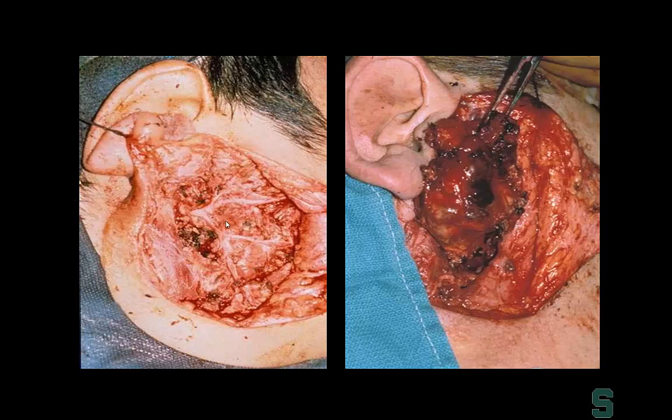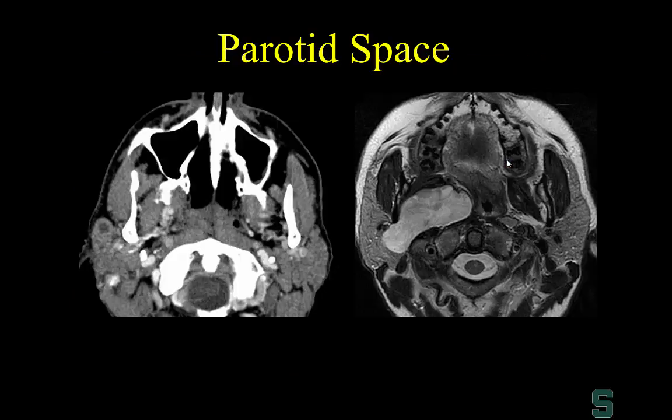And one of the main things when we look at head and neck imaging is, as I mentioned before, the real value that we have is not only to identify that there's a mass there and potentially look for, if you will, more malignant findings, but really trying to determine whether it's involving the superficial lobe or the deep lobe. Because with a superficial parotidectomy, the surgeons do not have to go deep to the facial nerve. Whereas if we say the tumor's involved in the deep lobe of the parotid, then the surgeons have to either dissect or potentially sacrifice the facial nerve in order to remove the full extent of the tumor.